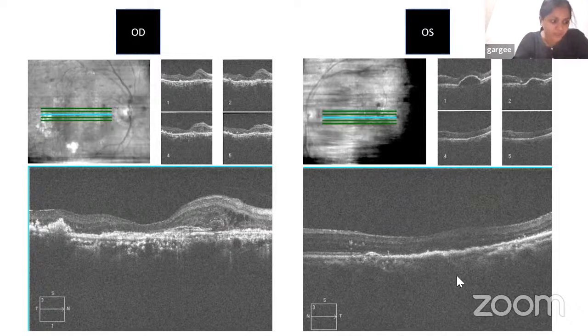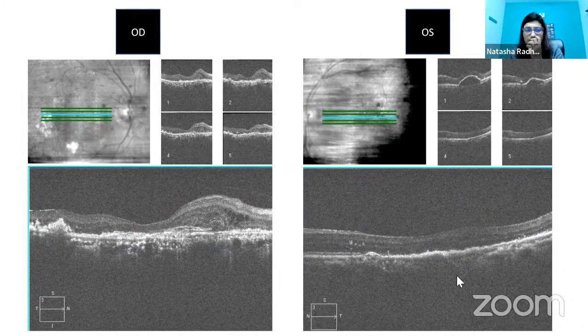There is an RPE complex irregularity. There is a hyperreflectivity nasally. Entire RPE is irregular and hyperreflective, and there is a foveal atrophy centrally. There is a sub-RPE hyperreflective focus. Okay, so these are all burnt down cases.